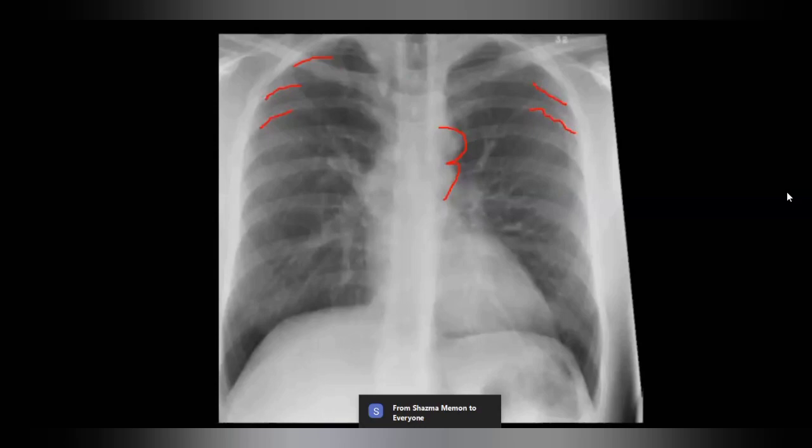So what do you call this condition? Coarctation of the aorta. Yes, so sorry, sir. No problem. Coarctation of the aorta. Any other differential for rib notching? I'm sure you will find it in Chapman or in other books. Yes, sir. It's neurofibromatosis, rheumatoid arthritis, or some bypass surgery in tetralogy of Fallot, or this can also happen in polio patients. Sometimes even if we have chest wall hemangiomas, but you see localized rib notching. In vascular hemangiomas, they are more focal, not diffuse like this.